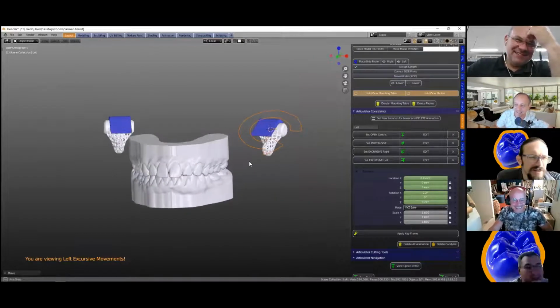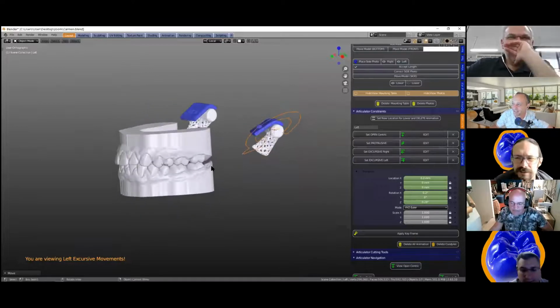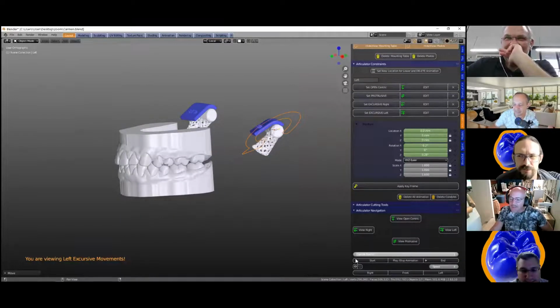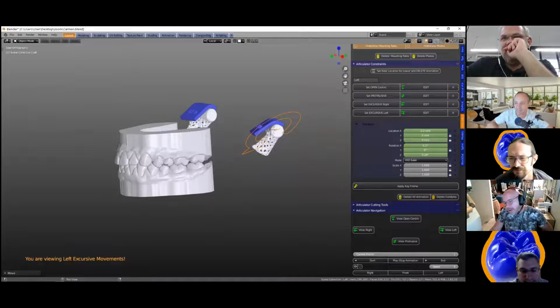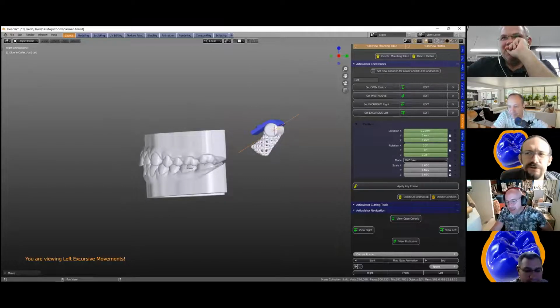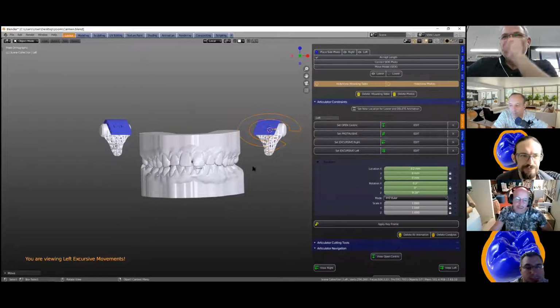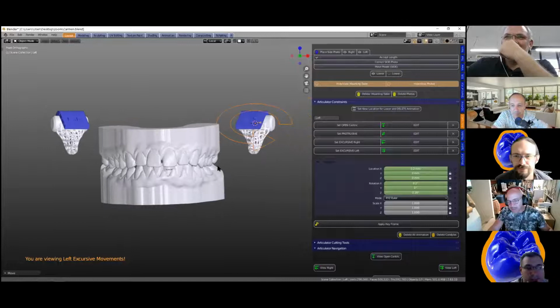I see there are new edit buttons on the articulator constraints. Can you show what they're used for? It's straightforward. It's front, it's right, and it's left. No, everything. Articulator constraints. You know there are these buttons here. Yes. Okay. We've actually had these for quite a while.